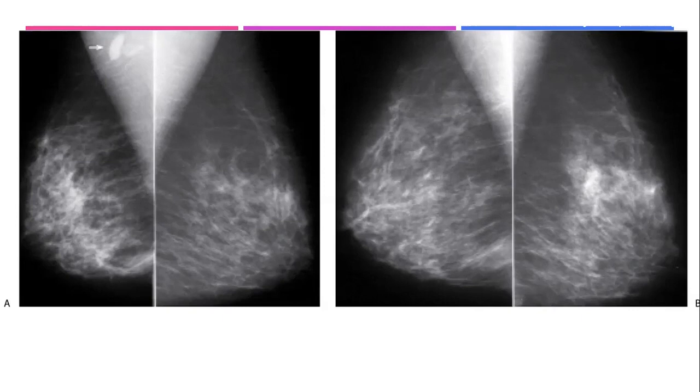So this is one of the pitfalls, not always picked up, because usually, especially if the contralateral breast is relatively dense, you might think that the larger breast is the site of abnormality, not the smaller breast. But we have to consider that sometimes infiltrative malignancy can result in a shrinkage breast or shrunken breast.